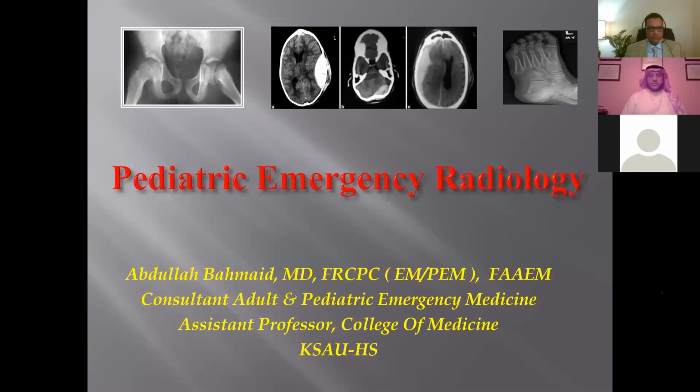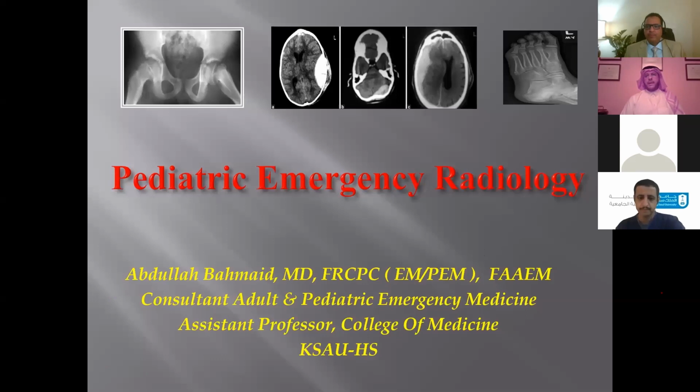Okay, thank you for joining us in this education program in pediatric emergency medicine. In this session, we're going to talk about some cases in pediatric emergency radiology. As you know, this is a huge topic, covering trauma and non-traumatic conditions in pediatric radiology. That's why we're going to focus only on traumatic pediatric emergency radiology, which you may face in your shift and clinical work.